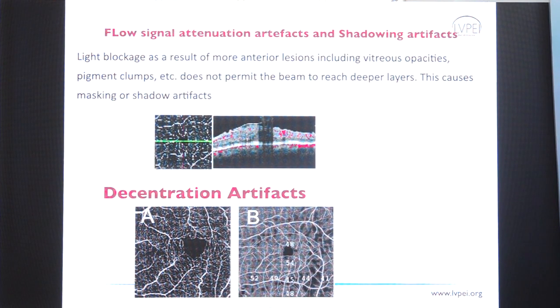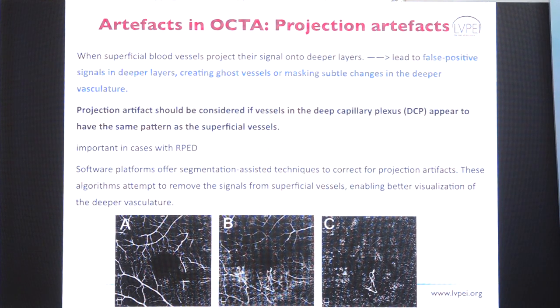Decentration artifact also happens because of the time of acquisition, and again requires one to repeat the scan at the same time. Two very important artifacts which we deal with daily are projection and segmentation artifacts.